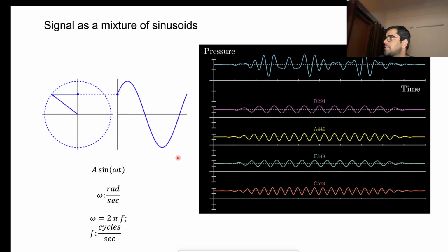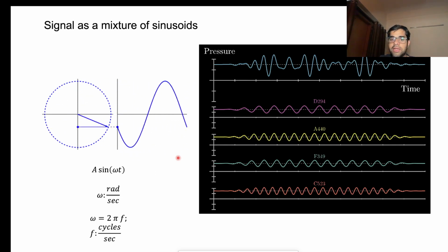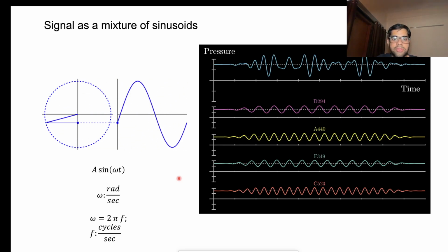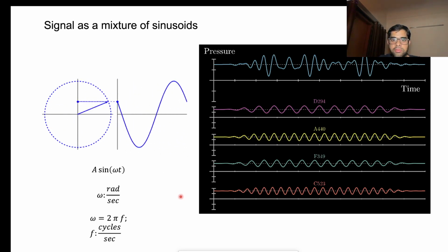So I hope this part is clear. If you have any doubts, please ask here itself, because we're going to use this extensively in the next classes also. And it is also important to know this for filtering and other pre-processing steps. Okay, hope it is clear.